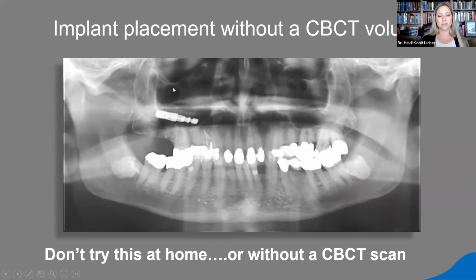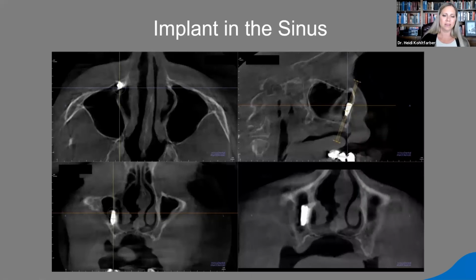And guess what? We found it with the carrier mount and everything. In fact, if you look closely at that implant, it looks just as shocked as we do that it's sitting there. But this is a very bad day. I'd say a bad day for the clinician as well as the patient. So we can try to avoid that with our 3D imaging.